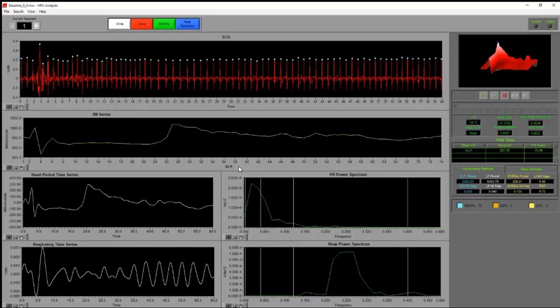may have missed. So for instance, when we're looking at this data and we see these very sharp points of inflection, that's something that, even if everything looks blue and that's the algorithm telling you that it's likely good data, we probably don't have to make an edit. This still would grab my attention that there is a lot more variability here than we see for the rest of this file. And there's certainly a shift here.